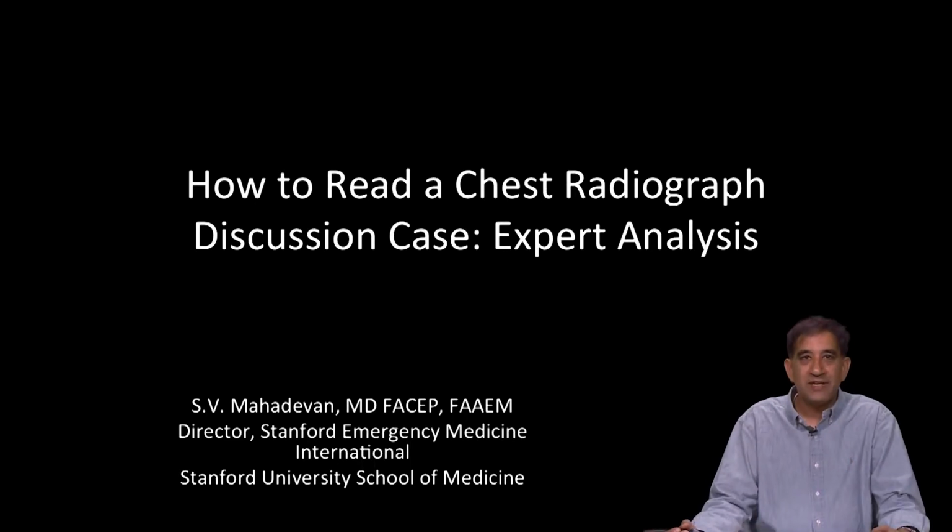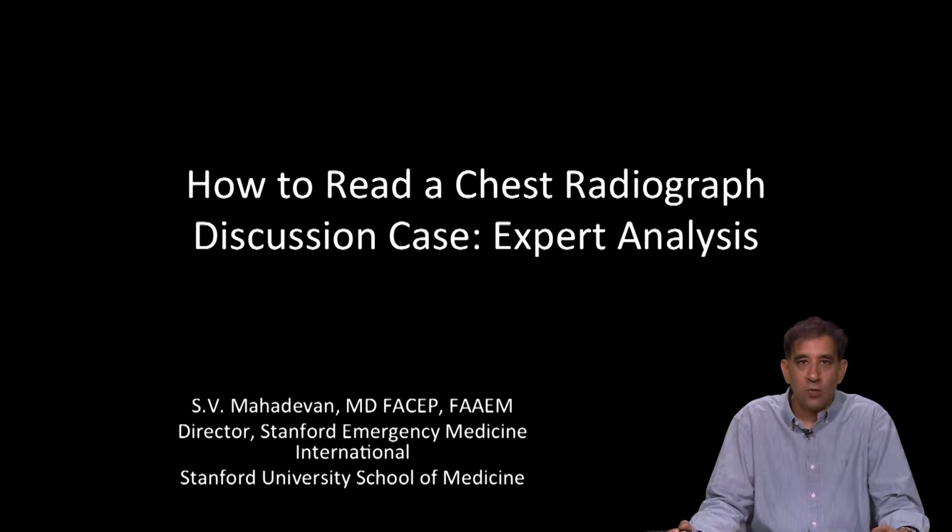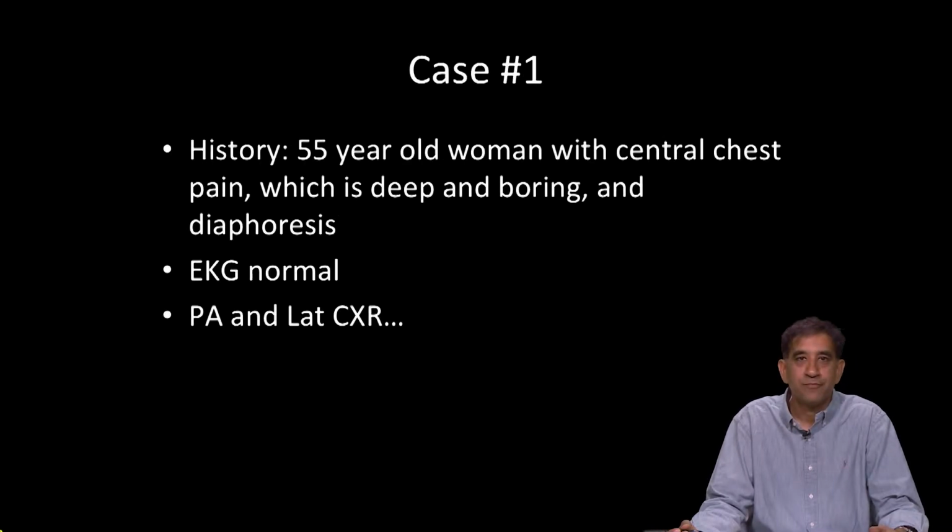Hi, this is Dr. Mahadevan again, and we're going to conclude with how to read a chest radiograph. We're going to provide now expert analysis on these 5 challenging x-rays. So let's move forward and do that.